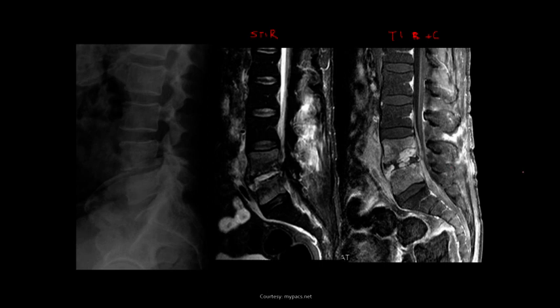So this person potentially could have had some surgery, or maybe they get some sort of implantation. I don't know, laid down on the ground on a rusty nail or something. Why they would do that, I couldn't tell you, but I'm just reaching here. Again, hematogenic spread is the most common source that we would expect this. So it could have been from elsewhere in the body, although the fact that these kind of areas, the vertebrae as well as the paraspinal soft tissues, posterior paraspinal soft tissues, makes me think it's a little bit more likely that there's some sort of direct extension from those areas.